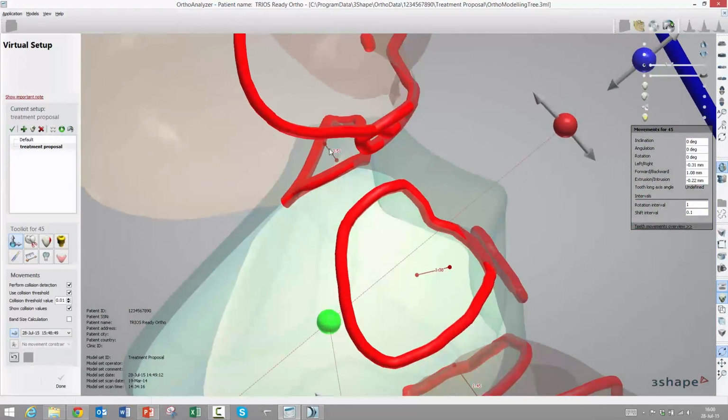If you look carefully, you can see this little segment showing in which direction the measures were taken. This is a very good indication if you want to do, for example, IPR, or interproximal reductions, because you can use it as a guideline. You could take a screenshot of this to keep in mind in which direction the IPR should be performed.